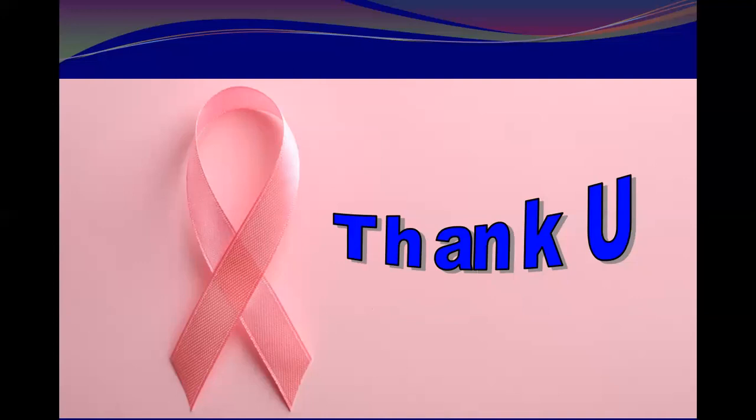Okay, thank you. And even the depths, you will imagine the lesion: if it is close to the transducer, or if you have seen it in the anterior part of the parenchyma, this is anterior, or if it is close to the chest wall, it is posterior. But if it is within the mammary zone in between, this is the middle. Okay, this depth is A, B, C, while the zones are 1, 2, 3.